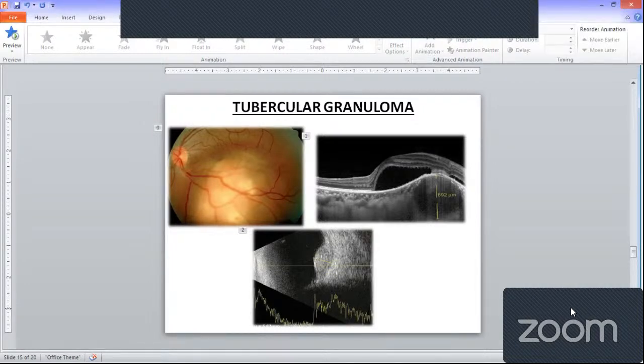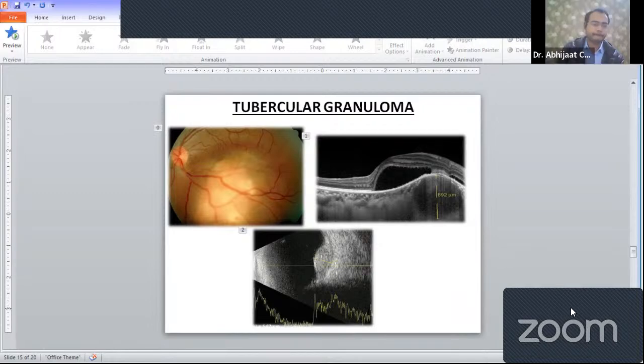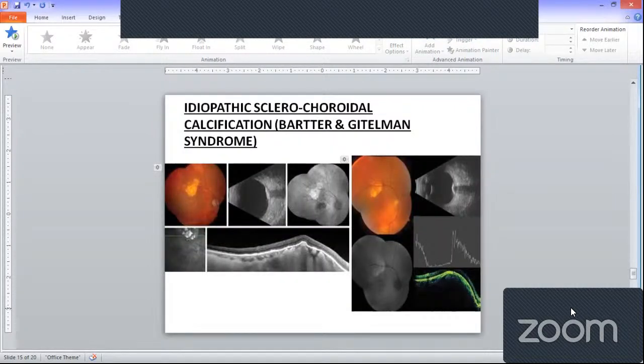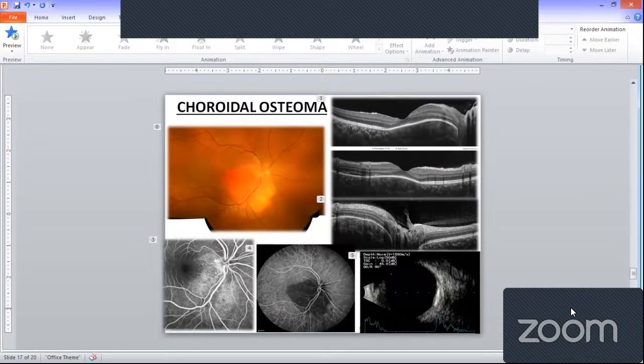So although spontaneous resolution of SRF has been described, what happens is that the tumor undergoes decalcification. And when the tumor undergoes decalcification, the overlying retina and RPE undergo atrophy. And so when it undergoes atrophy, the tumor changes. If you see in our case, at the edge, the yellow-white areas are the areas where decalcification is occurring, the inferotemporal arcade area, whereas the central macular area is still orange-red, so that is the area which is still not decalcified.